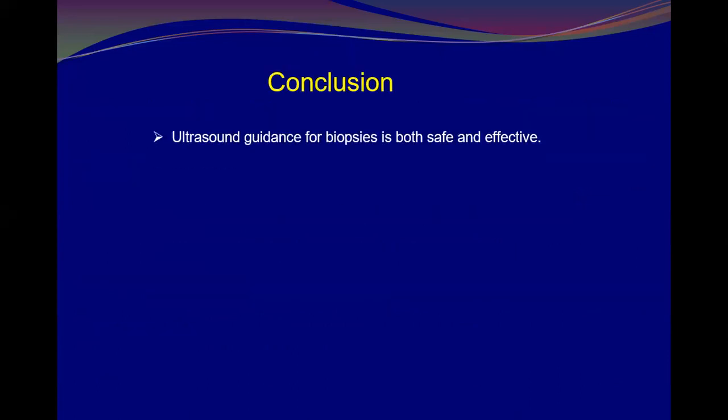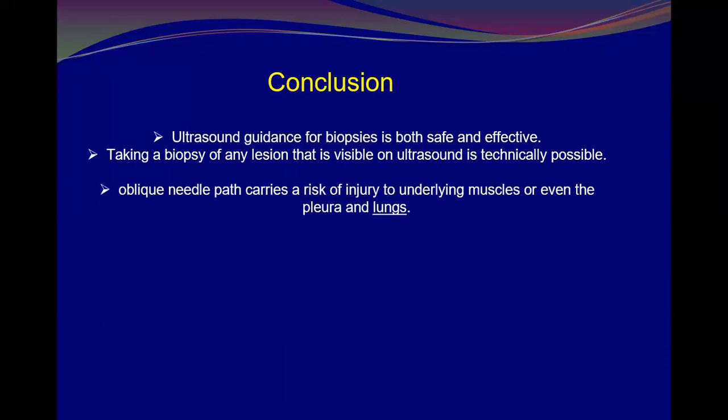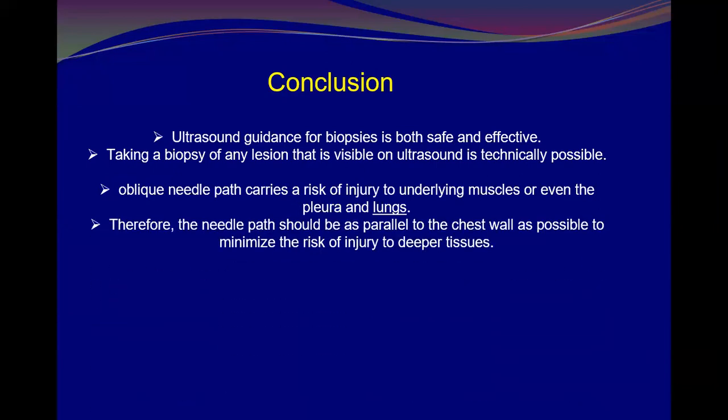Ultrasound guidance for biopsy is both safe and effective, and taking a biopsy of any lesion that is visible on ultrasound is technically possible. An oblique needle path carries the risk of injury to underlying muscles, pleura, and the lung.